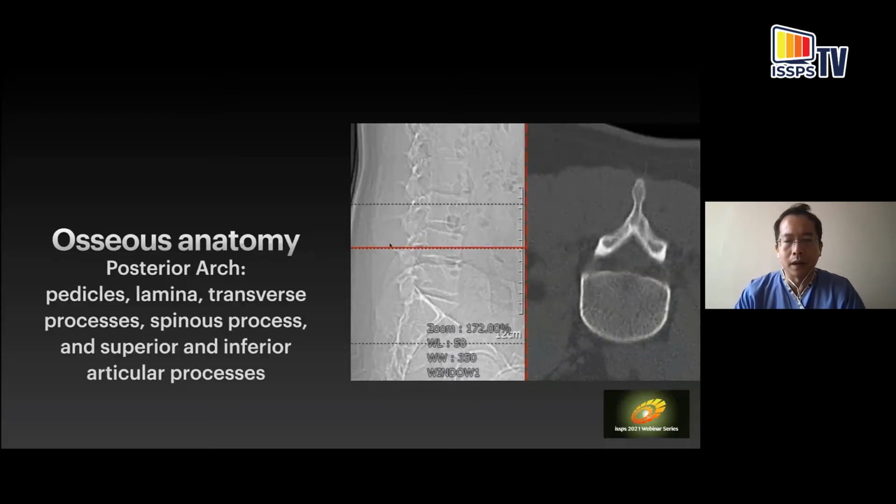And now we're moving slightly below the pedicle. And now you see the appearance of the exit foramen. So this is the level of the exit foramen below the pedicles. You will still see a little bit of the spinous process if you're scanning directly perpendicular to the floor, as we do with the CT scanners. So the spinous process follows down into the lamina, and then from there, the appearance of the exit foramen with the nerve root not seen at the moment.